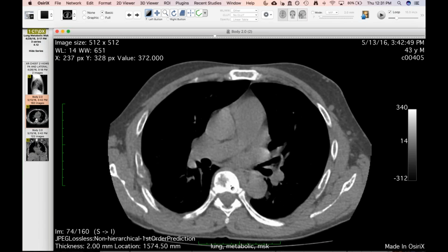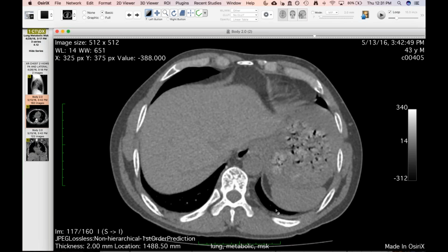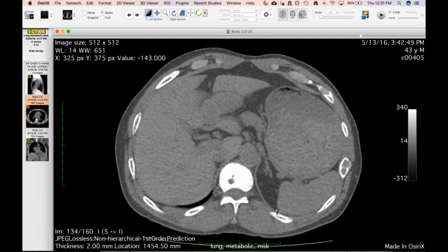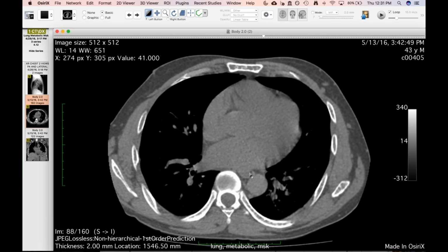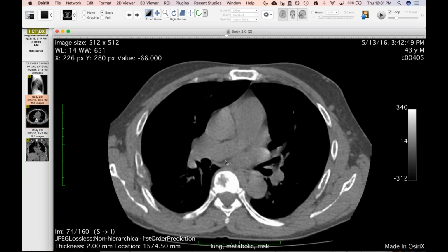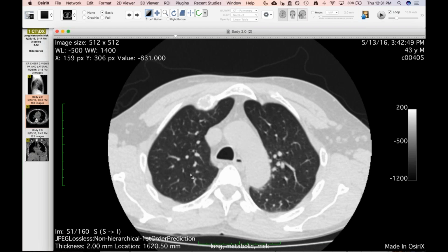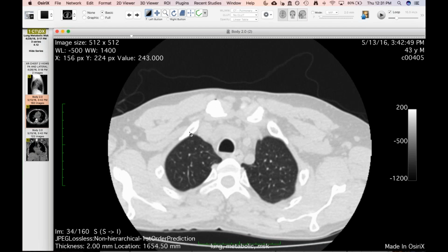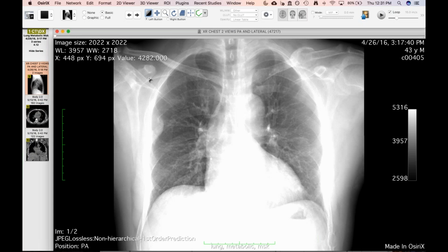And you can see even in his vertebral bodies, and this was back in 2016, he underwent a renal transplant last year, and I think the transplant team agreed that they were probably brown tumors and never even felt the need to biopsy one of these. So I was hoping that they would, just so I could have proof of it, but I think that's probably what it is in the setting of long-standing end-stage renal disease. Would you agree?